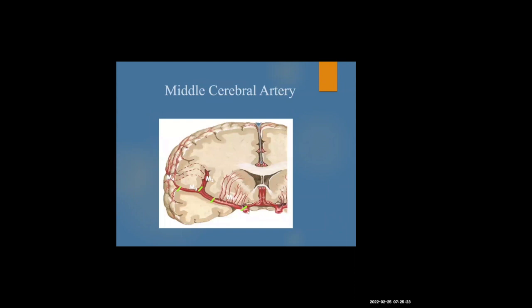All right, so this is your ICA terminus that's cut. And then we get into our M1 MCA segment right here. As we extend more peripherally, the MCA generally bifurcates, occasionally trifurcates in about 15% of cases, and it goes into the circular sulcus. And these are the M2 branches. There's generally a superior and inferior division. And then it makes a hairpin turn, and these are referred to as the M3 MCA branches. And as it exits the sylvian fissure, you have these cortical M4 MCA branches.